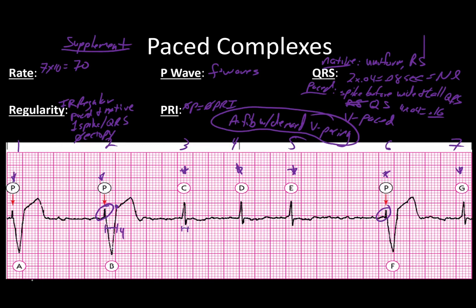To add some more context to this, to give you a better idea of what's going on, I'm going to erase some of these marks here real quick. You can figure out exactly, well, not exactly, but very closely to what the pacemaker's function is based on when it kicks in. So if we measure between beat number 2 and beat number 3, which is about right here, and the beginning of the QRS, which is right here, that comes out to about 25.